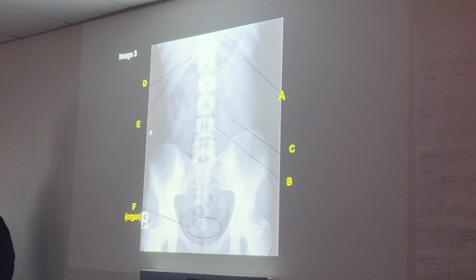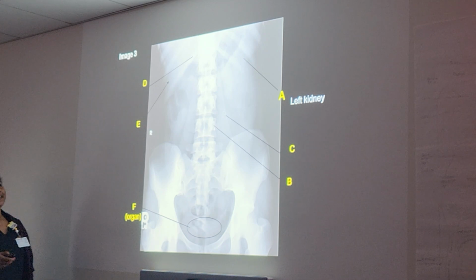Somebody help me. Are you asking about the intercostal space? No. But that's what it looks like, part of it right there. I wonder if it was an organ. Left kidney. I said that.